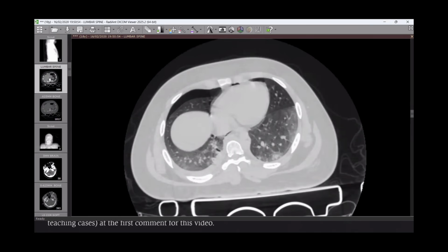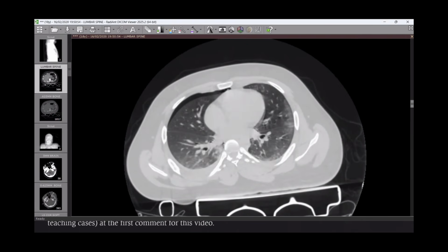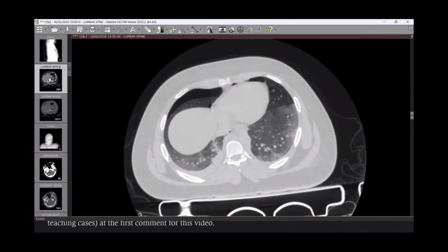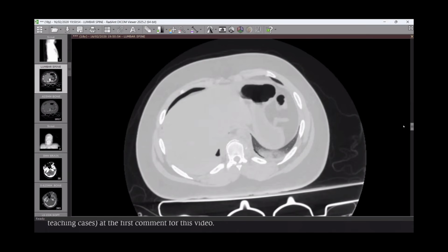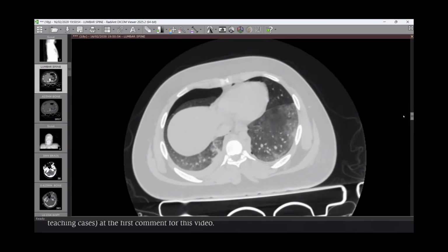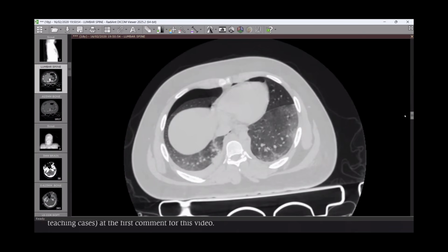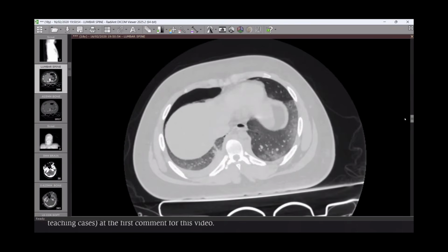I will have a look, one second. There is evidence of left pneumothorax noted, and bilateral ground glass opacity in both lung parenchyma, with this region on the left side. This could be pulmonary hemorrhage or pulmonary contusion. With this thorax, I also want to look at the bone window to see if there are fractures in the ribs or in the vertebrae. Do you have any fractures?